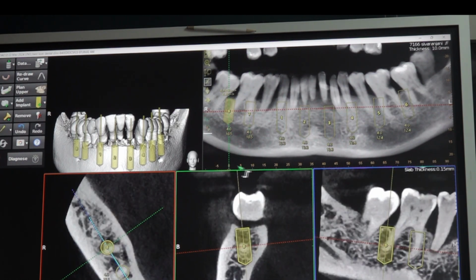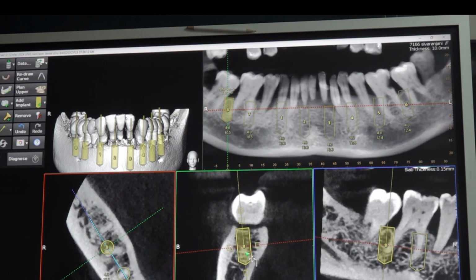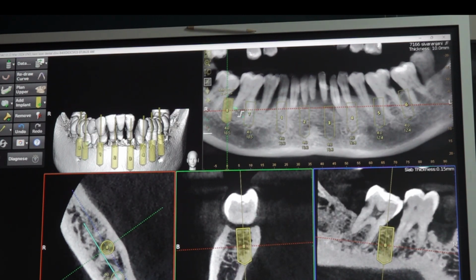Avoid as much as possible placing on the 7 distal root or mesial root. Access-wise they become difficult, with closeness towards cheek or tongue. Even if you place implant in the interdental bone between 6 and 7, you can give 7.